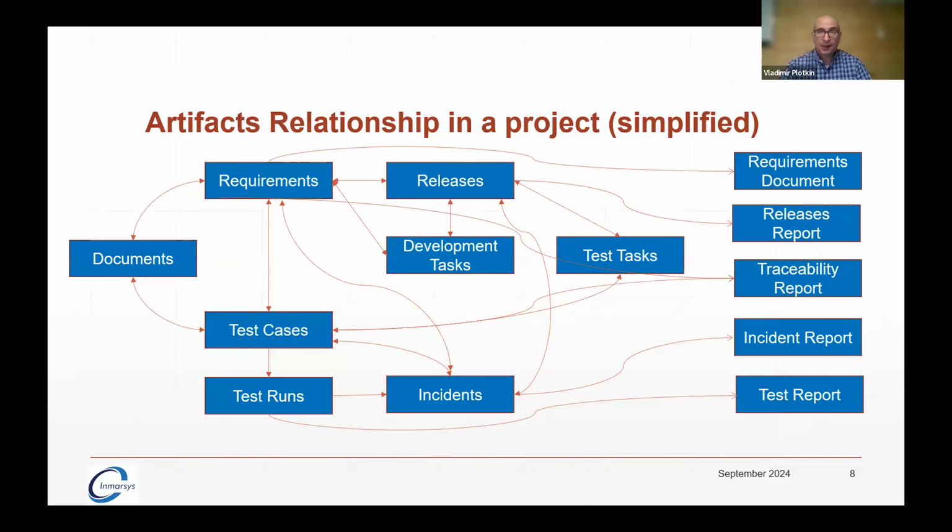Also, documents can be real documents, so you can import them from QMS. For example, when you're talking about coding standards, if your requirement says the software shall be developed to this coding standard, it might be useful to simply attach the coding standard to the requirement, and then it goes to the document so people know exactly what you're talking about.